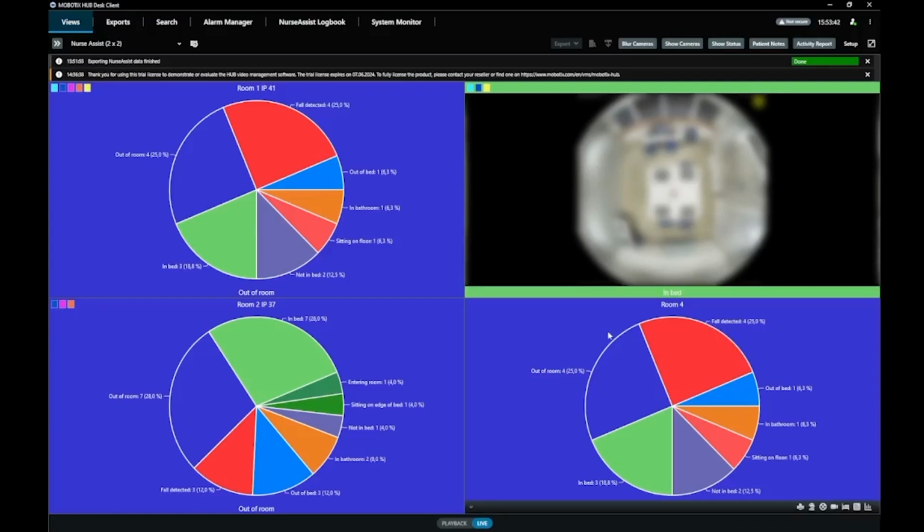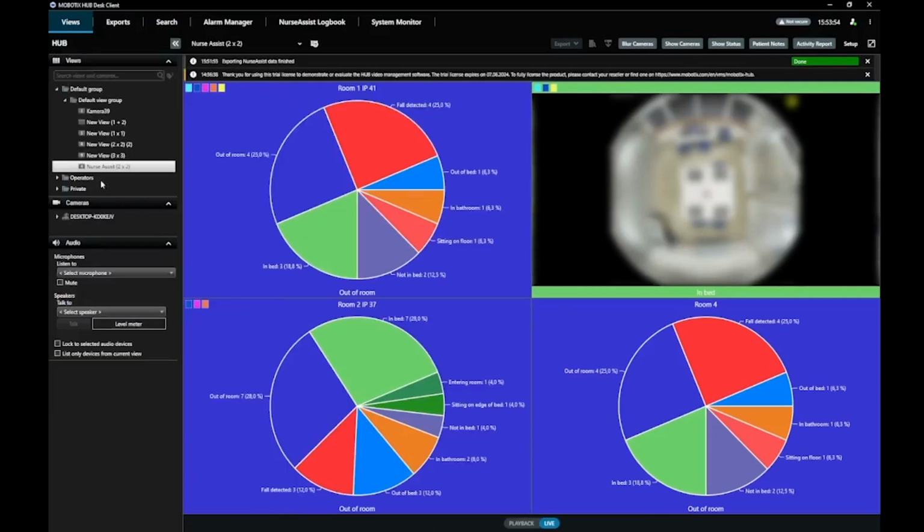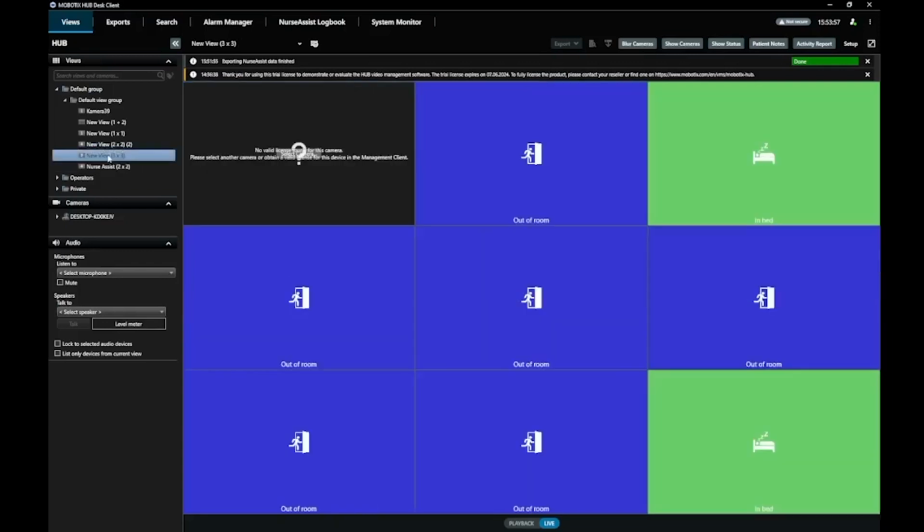before I forget, you have seen on the upper right side, shortly, the inactivity counter. It means another privacy protection. If the nurse forgot to switch it back to the status view, then the system will do that automatically after 30 seconds. Let us come back to different layouts.